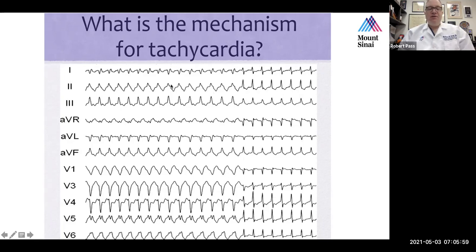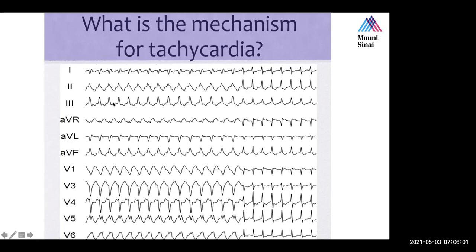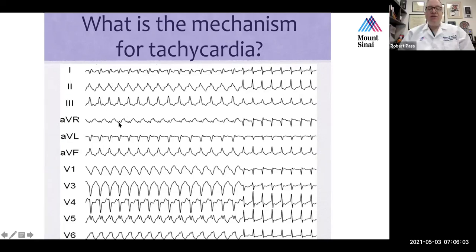So as you said correctly, the tachycardia is warming up, so there is bundle branch aberrancy as the bundles are warming up, as they say, until it narrows. And the R-to-R interval on the left-hand side of the screen, as I explained, is slightly wider than the R-to-R interval on the right side, or the left versus the right.